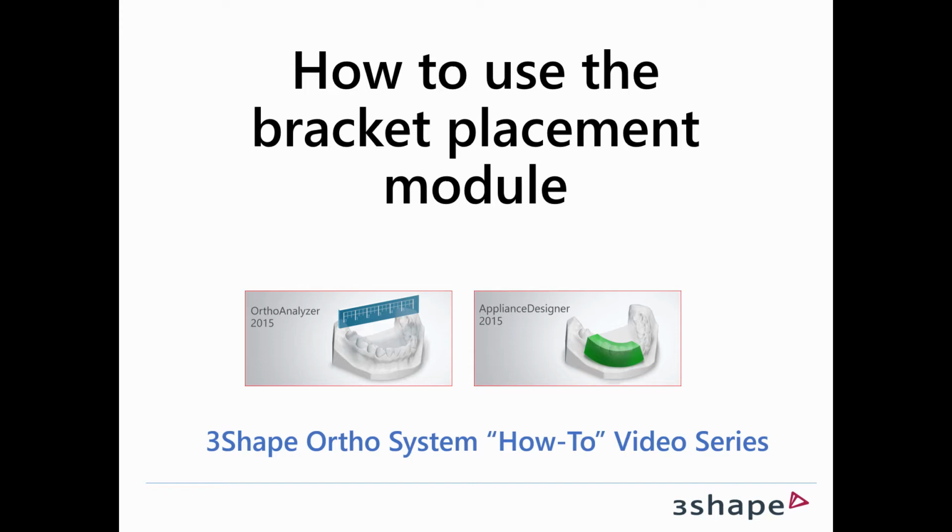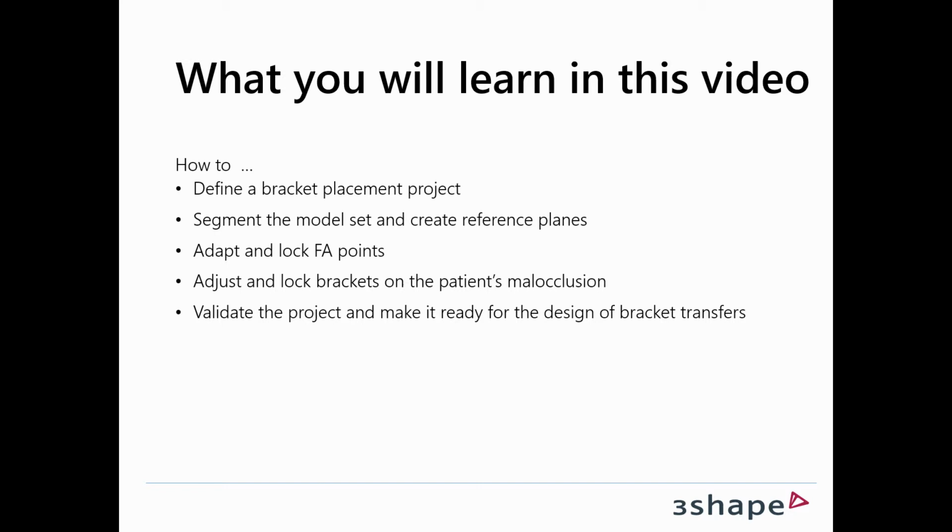Hello Christoph. Hello. So what you'll learn in this video is how to define a bracket placement project, also how you segment the model set and create reference planes, how you adapt and lock FA points, how you adjust and lock brackets on the patient's malocclusion, and also finally how you validate the project and make it ready for the design of the bracket transfers.